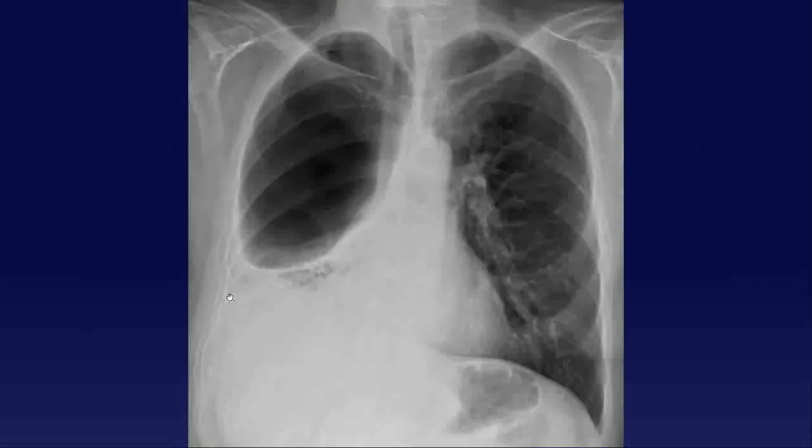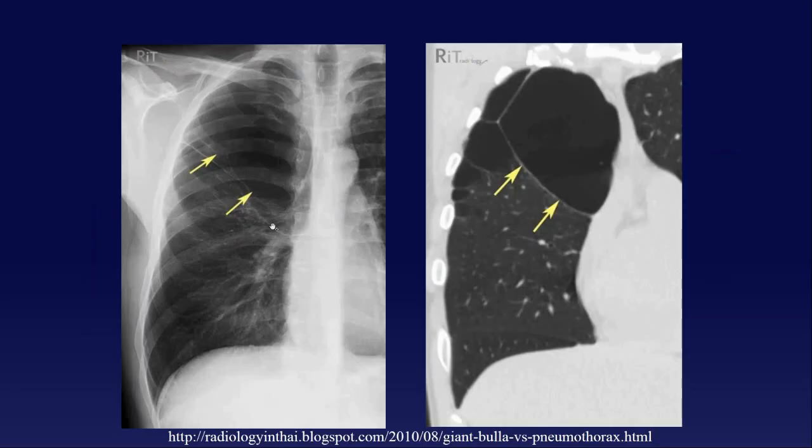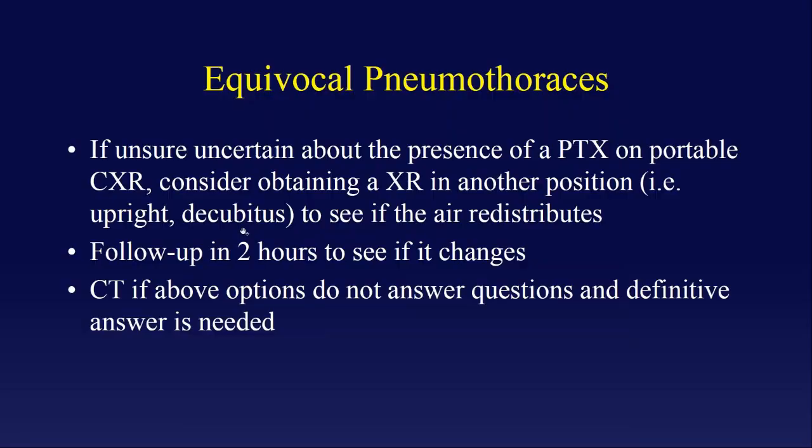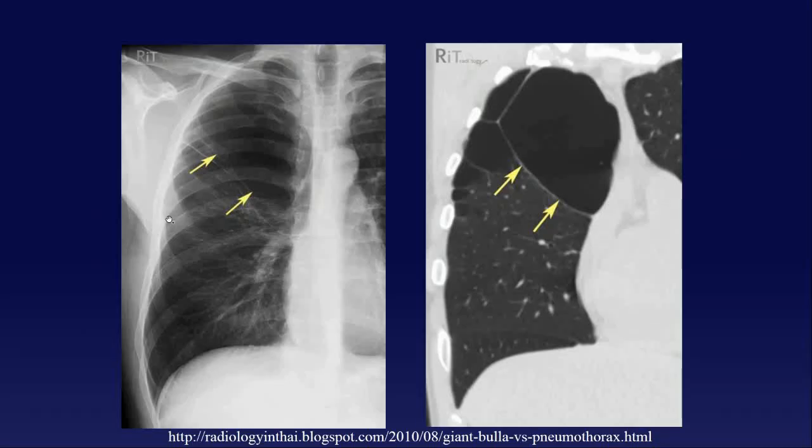Well, at the level of, and this is hard, okay? This is the hilum here. If you measure laterally like that, that's what they mean by air rim. So it's on the outside, at the level of the hilum, you measure that. Greater than 2 centimeters, that's a large pneumothorax. If it's less than that, and this is all relative. Honestly, what's large is something that causes symptoms.